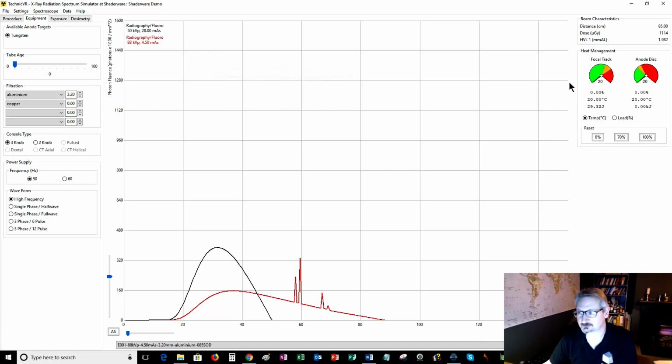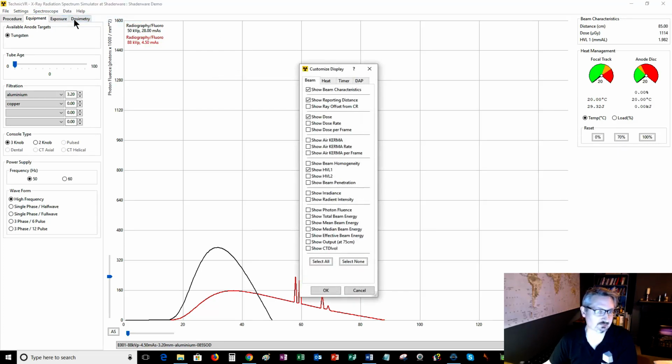So you can fiddle on with this to get it how you want it for a given purpose. It will remember that, so next time you log in on that particular computer, it will be in that format. So if you do that on a shared computer, then your colleagues might wonder what's happened. So you maybe have a policy where you always leave it how you expect to see it.